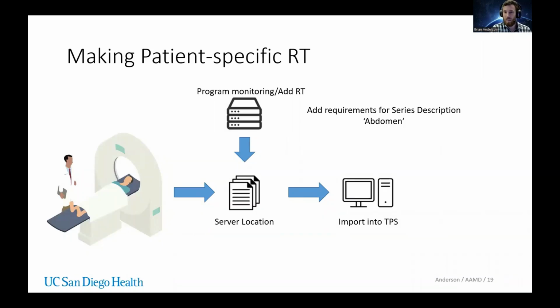All right, so what I'm going to cover relatively briefly right now is how you can run the program as a patient-specific RT structure creator as a standalone server. Effectively, the general workflow is that after a patient sim has occurred or any kind of imaging, the DICOM files are sent to some server location that the program has been told to monitor, and it will then create a patient-specific loadable RT structure file that just gets seamlessly imported into your treatment planning system whenever you import from that file location.